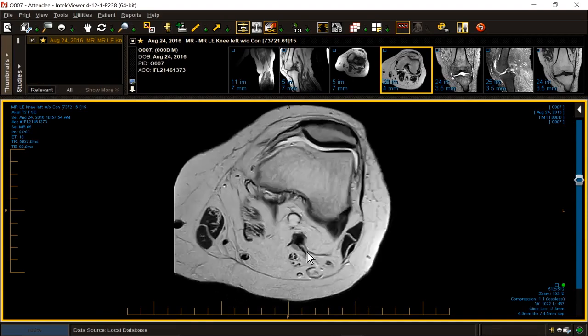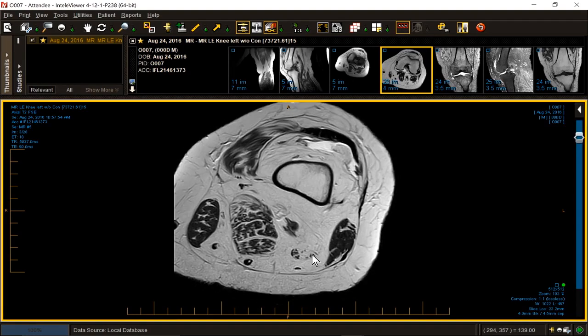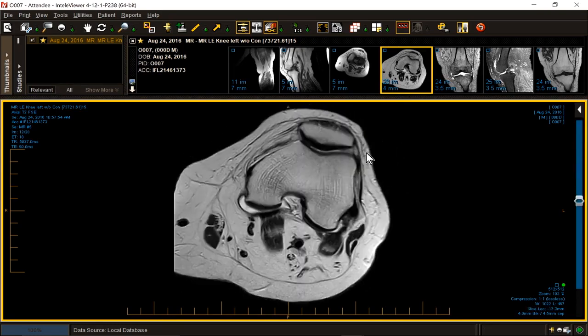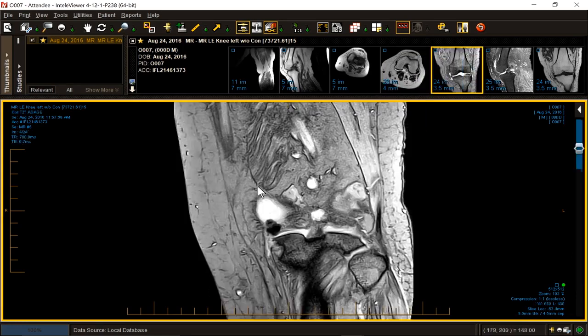How is my peroneal nerve? Looks fine. There's my tibial nerve. There's my peroneal nerve. How are my muscles? Not so good. Got some fat in those muscles. Patient has a minor case of biscuit poisoning. That's relevant because patients with biscuit poisoning have a high incidence of anterolateral patellofemoral impingement syndrome. They get other issues that are unique.